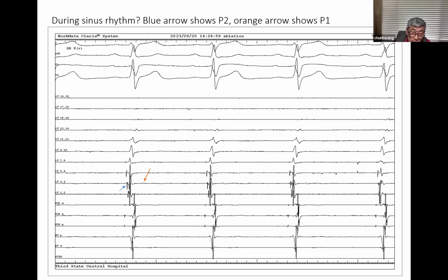Because the left ventricle in a young male patient or normal heart is a very small cavity during systole, your catheter is subject to recording much mechanical noise, particularly around the papillary muscle, where you will have contraction of the papillary muscle, chordae, and so on. So that is even more distinctly possible.